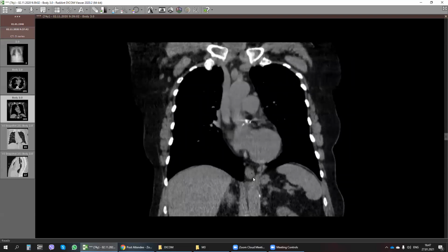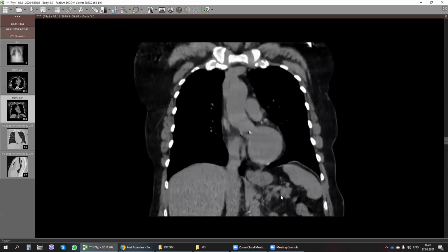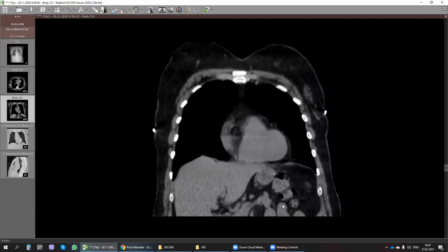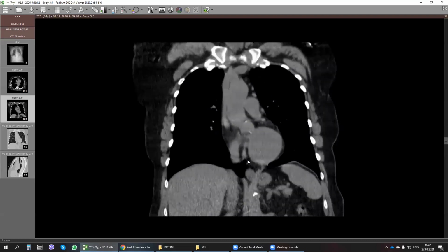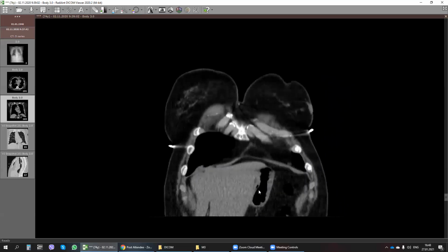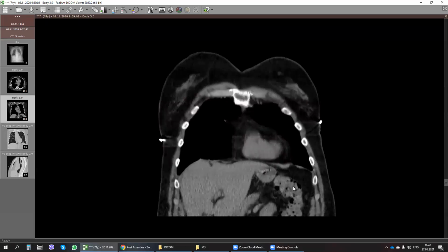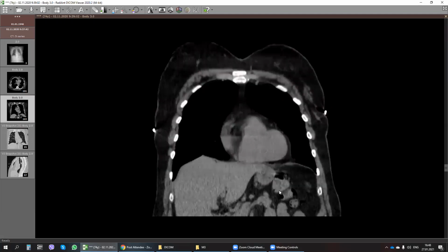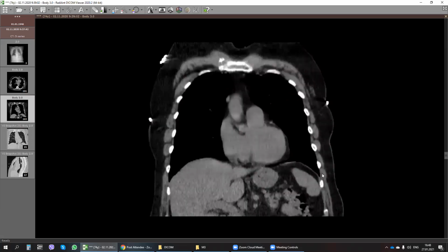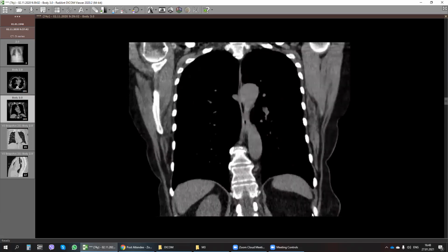If we talk about the internal organs, we can see only part of the abdomen: the liver, the spleen, the vessels, arteries supplying the spleen, the stomach, esophagus, stomach, gas inside the stomach, the intestines, the large intestine, the descending colon, transverse colon, and part of the upper poles of the kidneys. Also can be seen the right kidney and the left kidney, the pelvicalyceal system of the kidneys.